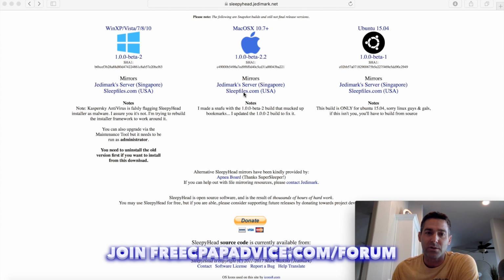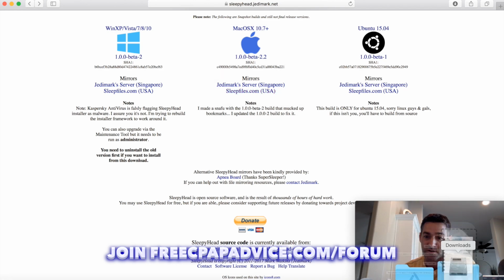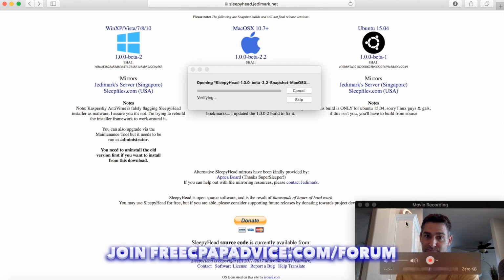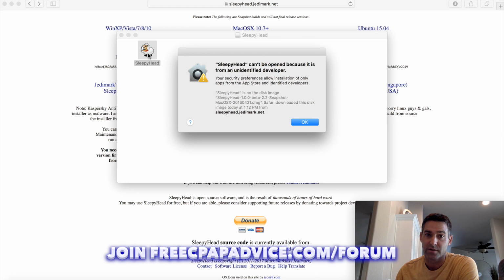Okay, so first thing I'm going to do is click on Sleep Files. Now, this is the first time I've done this with Mac, so this is all new to me. I've done it on my PC. It's been a while, so we can suffer together. Looks like it's already finished. And we're going to go ahead and double click. Cool. Double click on the sheep. It seems like Mark Watkins has a strange fascination with sheep.